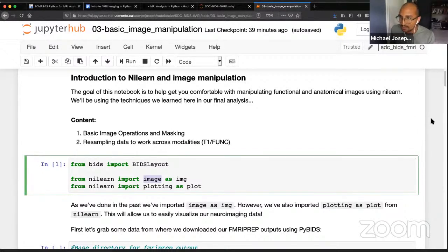Oh, so yes, I think we'll get to that eventually, but this was intentional. For a lot of fMRI scans, the first couple time points are typically called dummy scans. These are time frames that have been acquired with high contrast, and after that the signal really decays. What those high contrast images are typically used for is head motion correction, because they have really good contrast. It's easy to align all the other images to those first few volumes. But for the purposes of analysis, we remove them.